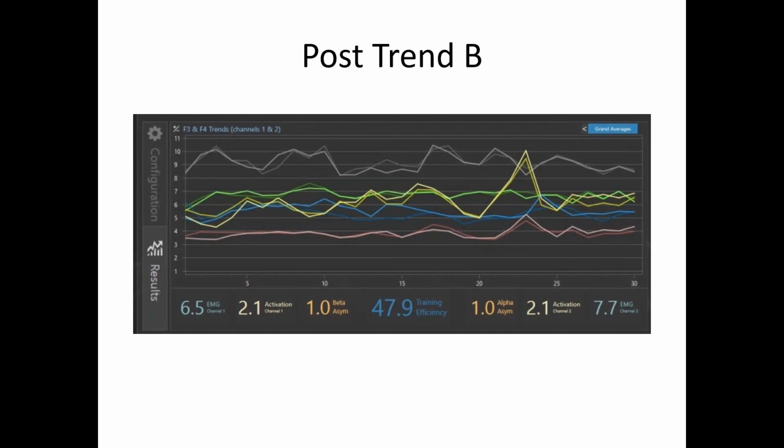And I can't tell you how many people are blown away by pre-post maps when they do alpha theta. They say, I put one sensor at one location, I did 20 sessions, I remapped, and holy mackerel, that brain has changed in a normative direction. See, I'm not an alpha theta religious person. Well, that's good. But the rationale is exactly that, Richard.